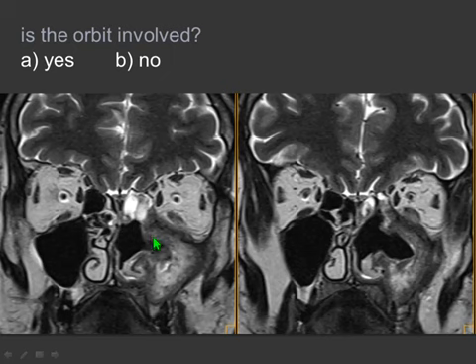The other point is, is the orbit also involved? This is easy. You can see that the hypointensity is transgressing the lining of the orbital wall. Therefore, I agree with you in this case very clearly. The fat tissue has been changed, and there is a thickening of the lining of the orbit at that level, also involving this rounded structure.